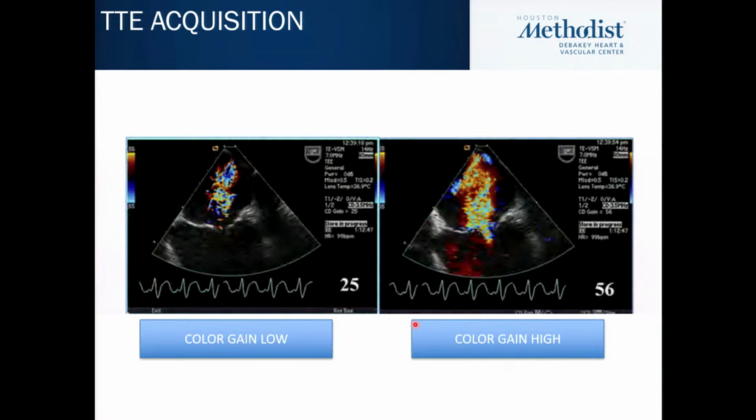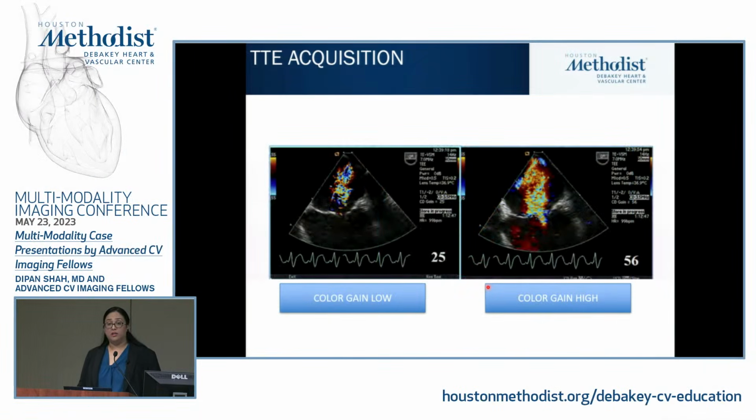So going through each of those characteristics, one of them was instrument settings. One is color Doppler. Color Doppler gain is a threshold-based technique such that a signal above a specific amplitude is displayed as color, and below a specific amplitude is displayed as absence of color or just grayscale data. So we can see that at very low color gains, you will have almost no signal or lower signal. And so lower color gain can give you the appearance of a jet being very small as compared to a higher gain, which can make the jet look much larger.